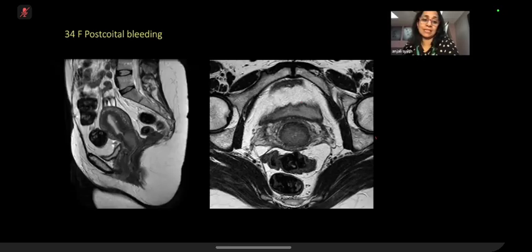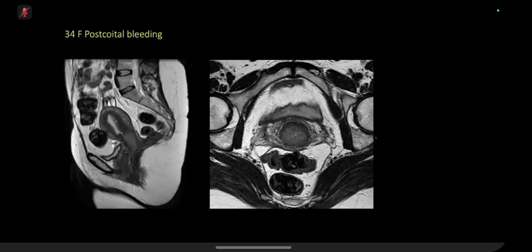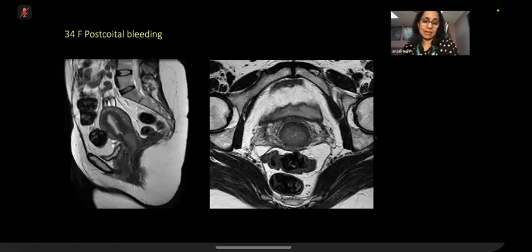So what are we looking at? What is the diagnosis? A cervical cancer. Yeah, this is a case of CA cervix. And let me take over now. CA cervix. So this is now confined to the cervix. The tumor is not involving anything anywhere else. It is confined to the cervix.